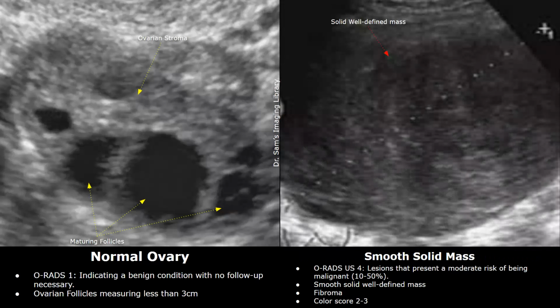A smooth, well-defined solid mass also falls under O-RADS 4. An ovarian fibroma usually appears as a smooth, solid, well-defined mass which can have a color score of 2 to 3, that is a minimal to moderate internal vascularity. So any solid smooth mass will fall under O-RADS 4.